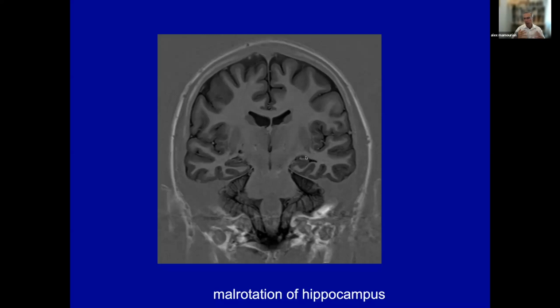So I'm showing you a lot in a little bit of time. This is one of the limitations of a course like this, is I can't show you everything, but I want to touch on some of these other categories of disease and make you aware of the sort of imaging that's going to help you in establishing where there might be an epileptogenic focus.